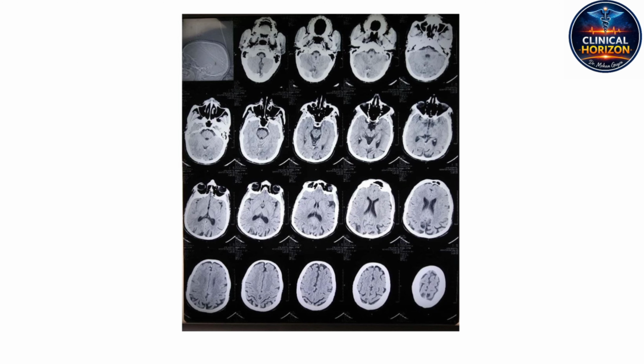Okay, let's unpack this, starting with our baseline demonstration. Scan 1, the foundation. Right. This first non-contrast CT is the gold standard of a healthy brain. The calvarium is completely intact. No fractures. None. And looking at the parenchyma, the gray and white matter differentiation is perfectly preserved. The ventricles are normal in size and contour, there's absolutely no midline shift, and we have clear basal cisterns without any abnormal hyperdense or hypodense regions.